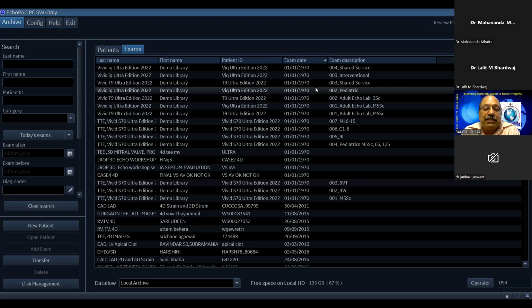In some cases, when you're looking for reduced ejection fraction, if you happen to see three parameters which I showed you, in those three parameters, one is positive, one is negative, and the third is ambiguous. So what do I do? I go to the pulmonary venous Doppler pattern. Normally the S wave, the systolic wave, is bigger than the D wave. If the systolic wave becomes smaller than the D wave, then I'm possibly looking at grade 2 diastolic dysfunction.